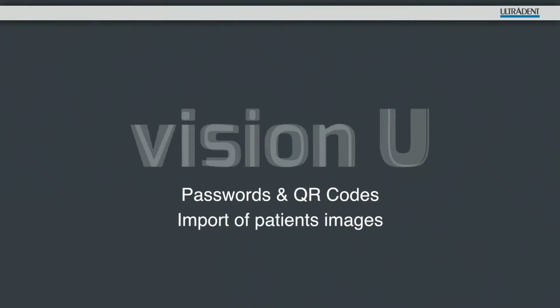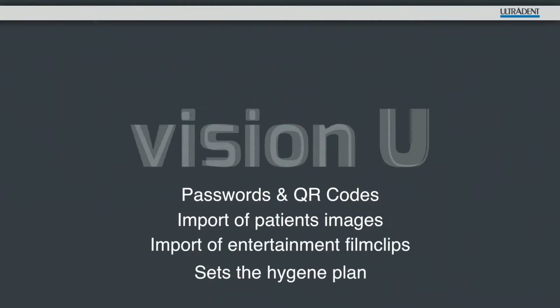It imports new patient images into the central database. It imports the patient entertainment films, and above all, it sets up the hygiene plan if you wish to deviate from the recommended default setting.